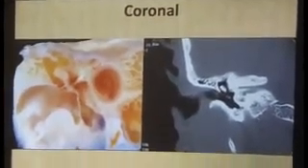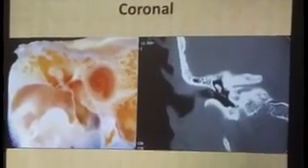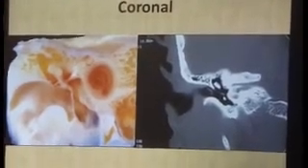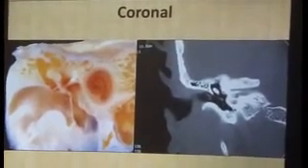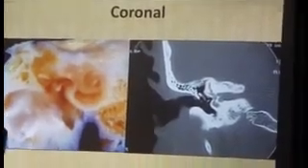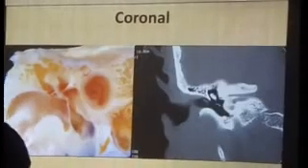A little more anteriorly, now this is the entire body of the incus. This is the entire body of the incus, but mind you, this is not the long process of the incus anymore, because the moment you have the incudostapedial joint, the incus is over as far as the long process is concerned. It's so flimsy, right?